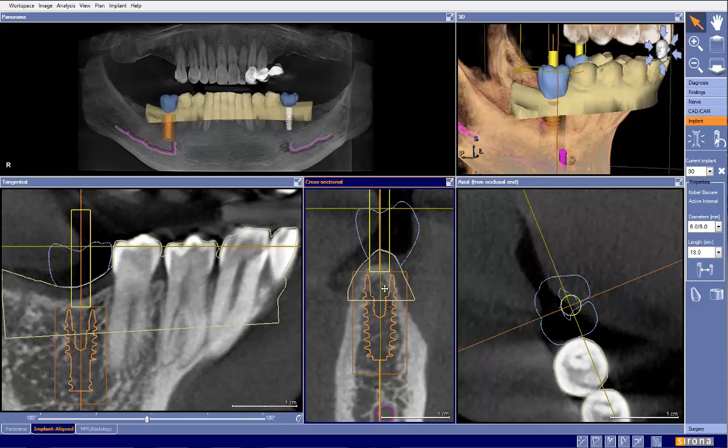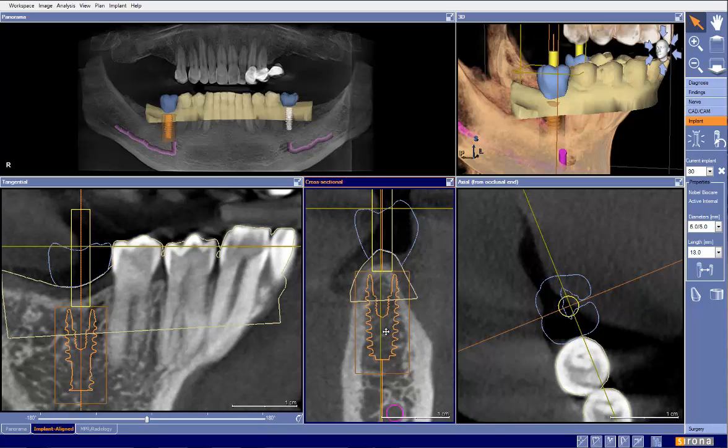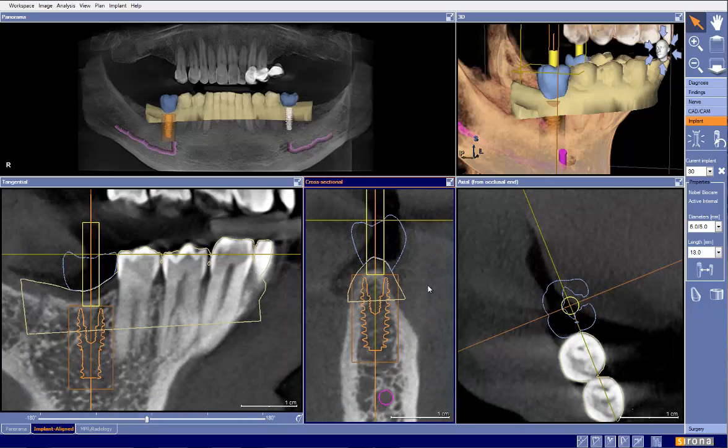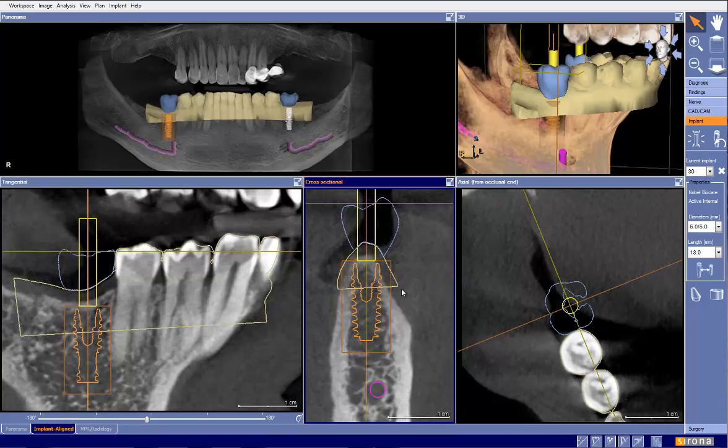The other thing we can do is we can just bring that a little bit to the lingual and then tilt that back there, and that is probably a little bit more ideal there, and go ahead and bring that up just a hair. Now in this particular case, I would be very, very comfortable placing this implant and grafting at the time of placement. Little mini flap here, make that pretty easy.